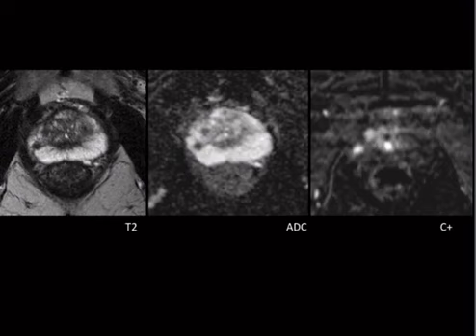All right, so let's do a classic case here. This is how prostate cancer is evaluated. If you've been asked to design a protocol for prostate cancer, you need a couple of different sequences. You need a T2, you need a diffusion with an ADC, you need dynamic contrast imaging with subtractions because they'll use enhancement curves just like in breast MRI.